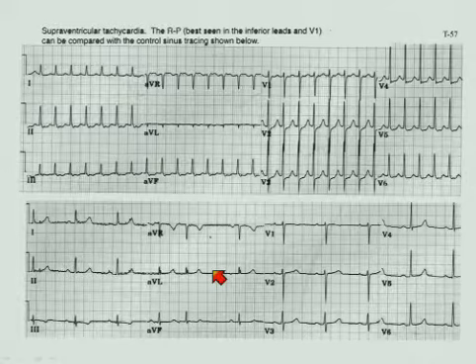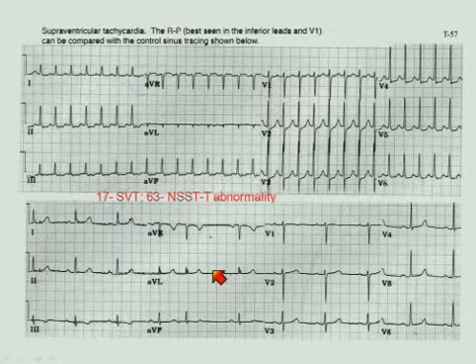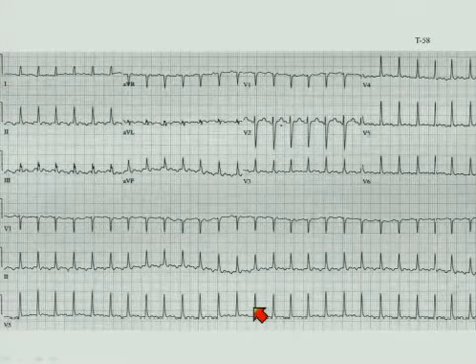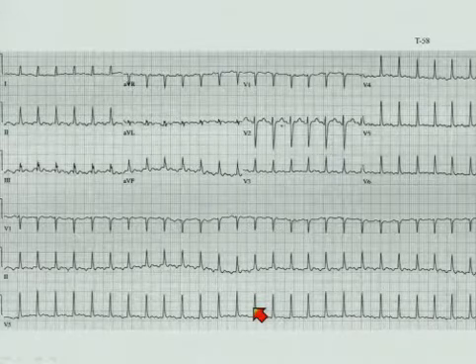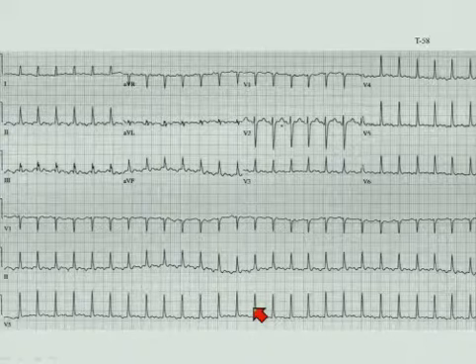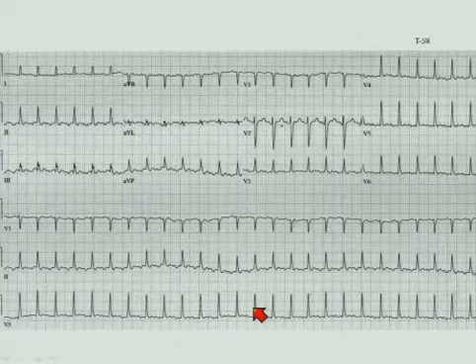This is just a supraventricular tachycardia. You saw several of these yesterday, and so I will not spend time with that. This one I will spend time on because this is an important tracing. You see these in the heart station all the time, and it's important that you consistently recognize it. I'll let you look at it for a second.